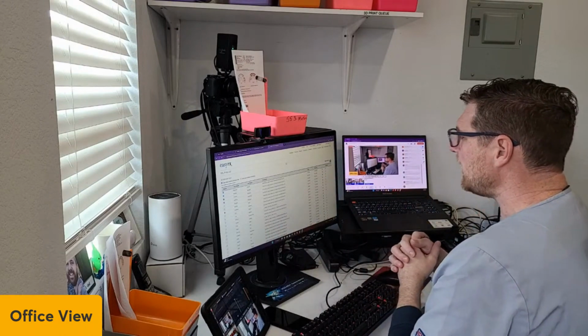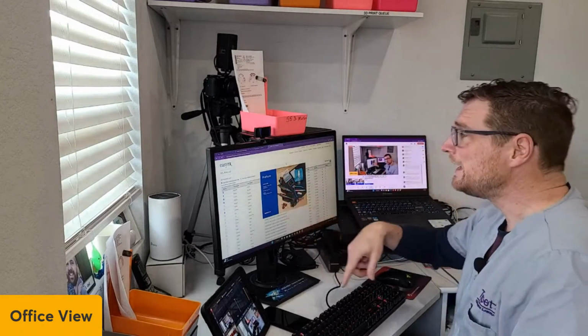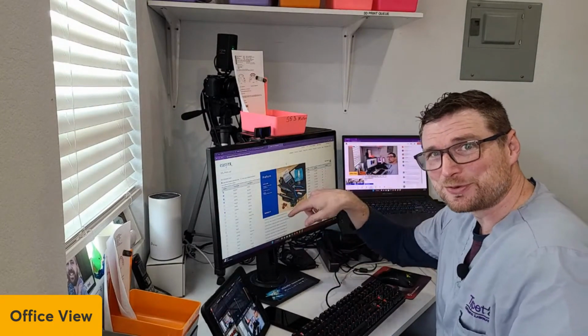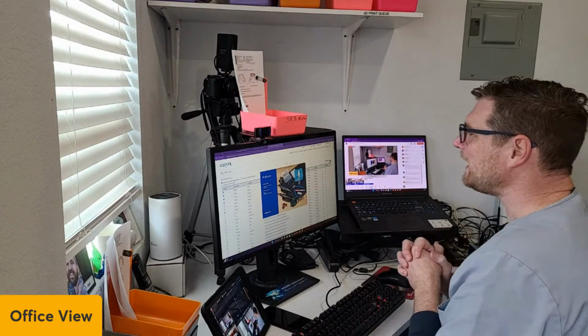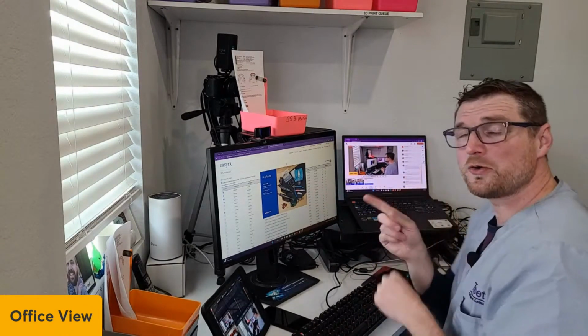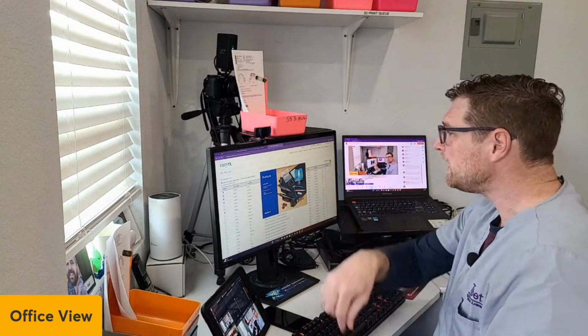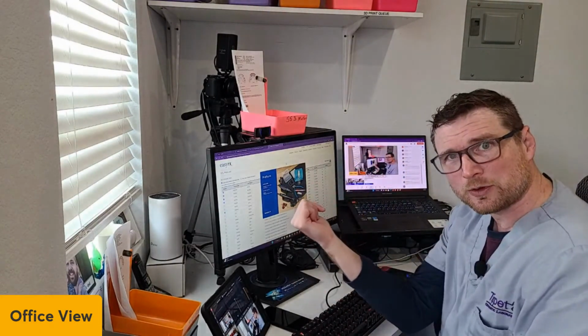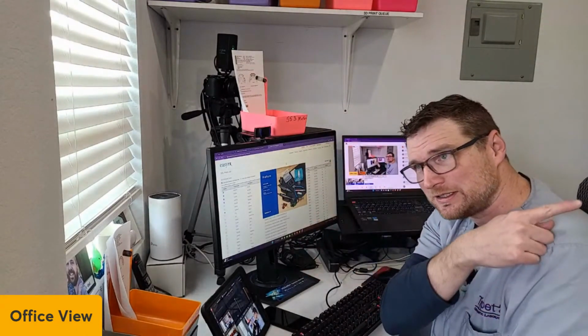And then eventually it's going to open Preform, and it's going to throw those models into Preform. I just love this feature. It is a great feature. And so there are no models being downloaded to your computer. It's downloaded to your RAM temporarily and then put into the Preform nesting software. And then that's what I'm going to use to send it wirelessly to the printers back there.